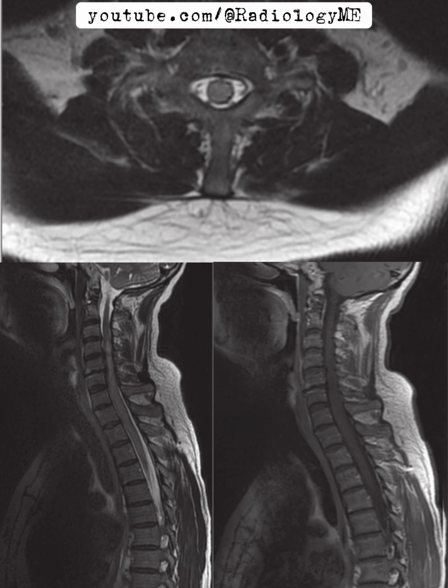The spinal cord is visibly abnormal from the level of C3 to T4. What grabs my attention first is that the cord is expanded at these levels. Looking more closely, there's an intramedullary lesion present, showing high signal intensity on T2 weighted images, which is quite homogeneous. When I compare that with the T1 weighted images, the lesion is mostly isointense without any significant contrast enhancement. This absence of enhancement is crucial and will help narrow down our differential diagnoses as we move forward.